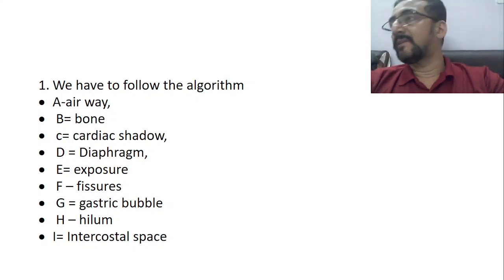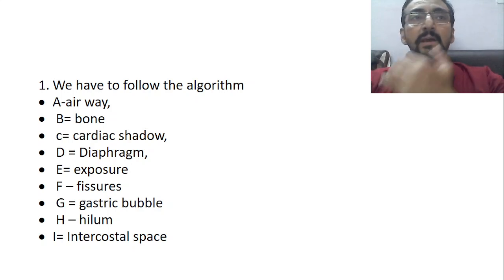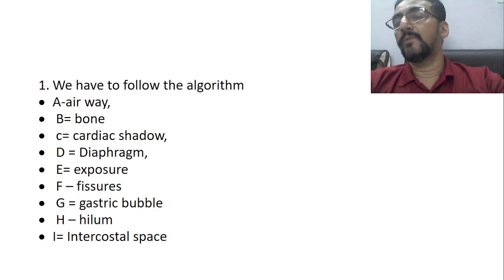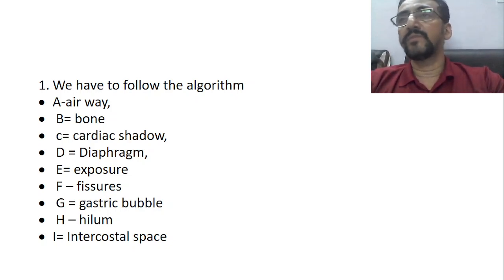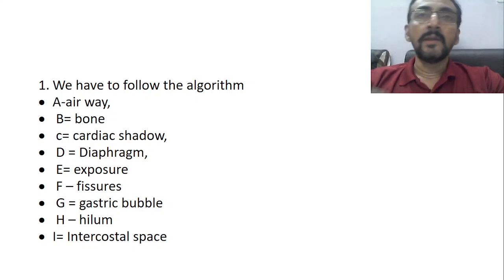I stands for intercostal space. Now this is very important. In the anterior area we are looking for the intercostal space. We know that intercostal spaces are always obliquely placed. The ribs are not placed straight or horizontally; rather, ribs are placed obliquely. So we speak of the bucket handle type of movement and all those things. So ribs are actually obliquely placed.